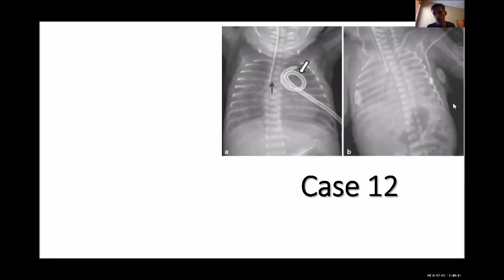Your tube is very deep. You can see there are probes here. There's 1, 2, 3. There is yet no feeding tube again. There is no good aeration of the bowel. There is a distended stomach. You can see a large liver, and there are fixed bowel loops. I don't see bowel movement very well.